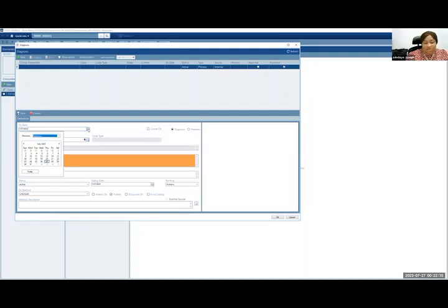The date she was diagnosed is the date that is on her pathology report or the biopsy report or whatever diagnostic means you're using. So if your diagnosis is from imaging, it should be the date on the imaging report. If it is from biopsy, it should be the date on the biopsy report. If it's from pathology, it should be the date on the pathology report. So I'm going to, again, use an assumed date here. So let's try and put it to 2022.